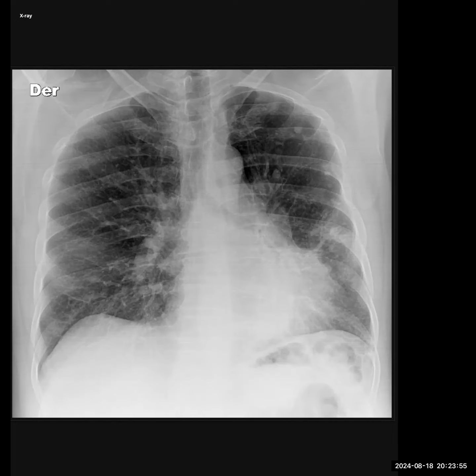Why are you suspecting an interstitial lung disease? Can you just summarize once more? Because there are coarse reticular markings bilaterally, more pronounced in the lower lobes. And I can also see some tubular opacities in the upper lobes, which I'm feeling could be bronchiectasis as well. Yeah. Do you see any other findings?